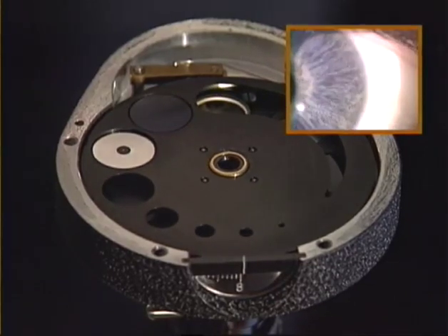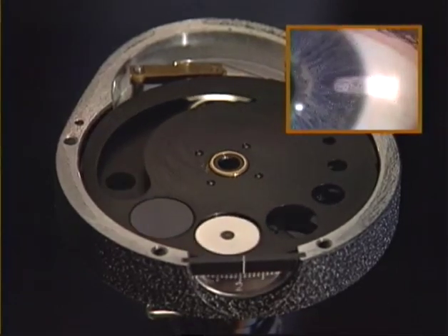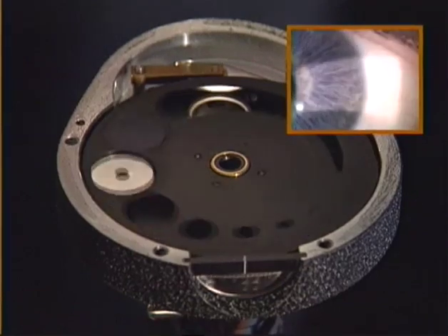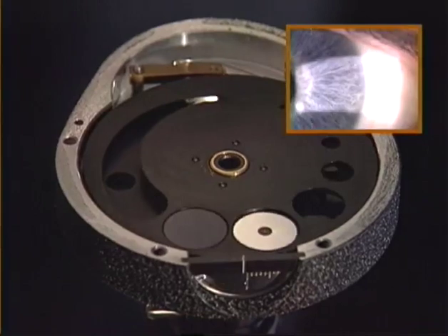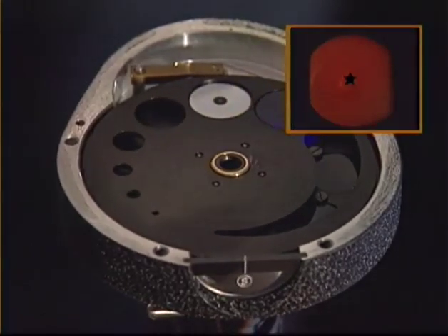The beam, however, becomes asymmetrical at the extreme positions of the continuous diaphragm, and this affects the shape of the beam at the smallest diameter. Turning the lever to either ends interposes 2 additional filters, a cobalt blue filter for exciting fluorescence, and at the other end of the scale a test mark with a fixation star for the examination of macular fixation.